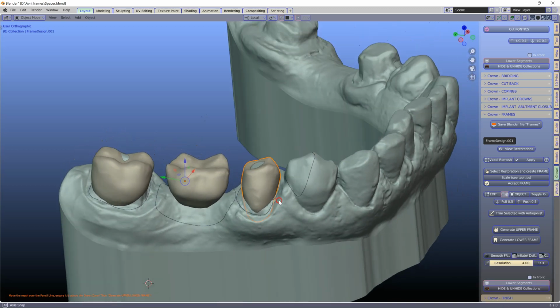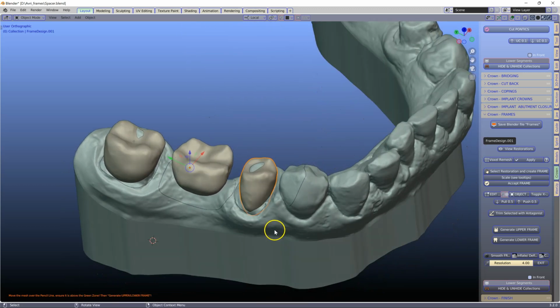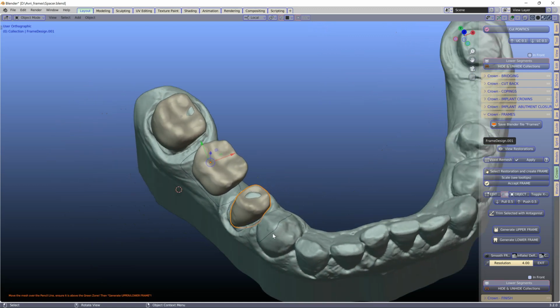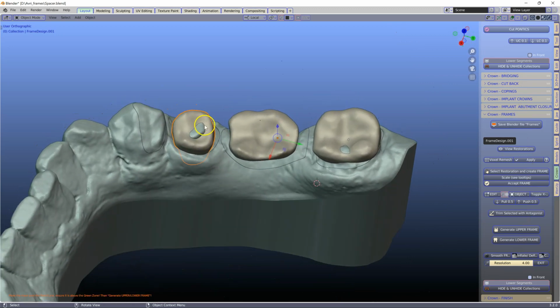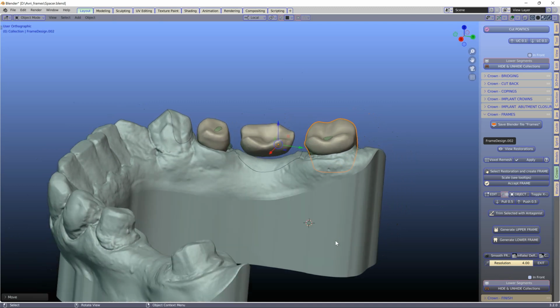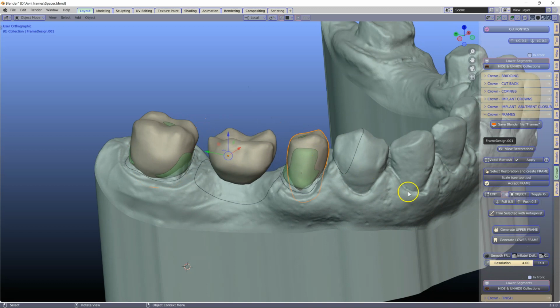Now we'd like to connect these up to our copings. This is quite easily done now. We can basically almost leave it as it is, although I'll just move that up a little bit. Okay, from here on, we're going to select this and generate lower frame.